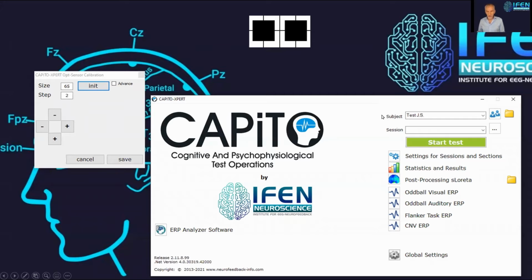This is the GUI, the graphic user interface of our stimulus presentation software, which, when presentation is started, sends the trigger marker simultaneously to the screen, where it can be detected by the photosensor. These markers then are sent to the trigger box and then further to the EEG device. I have already shown this in the previous slide.